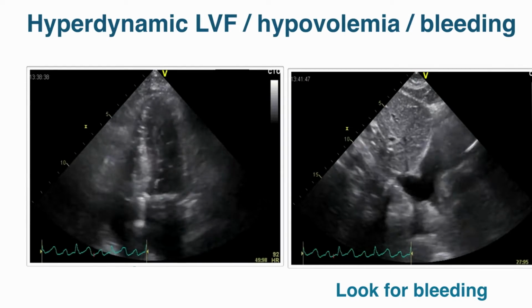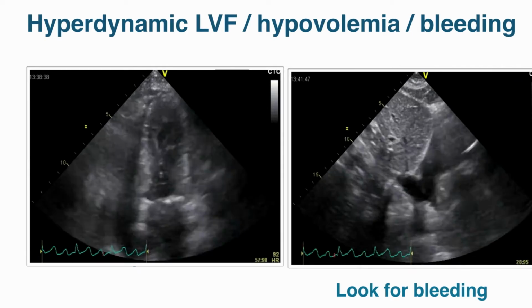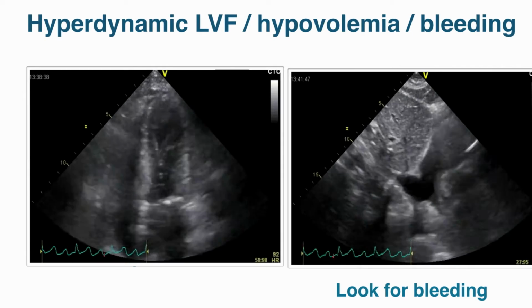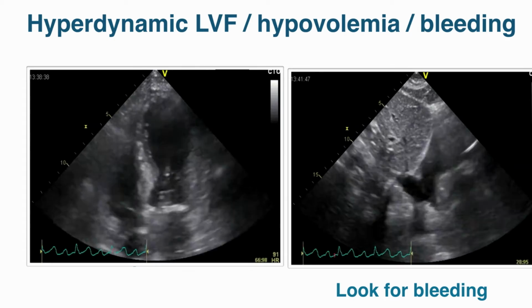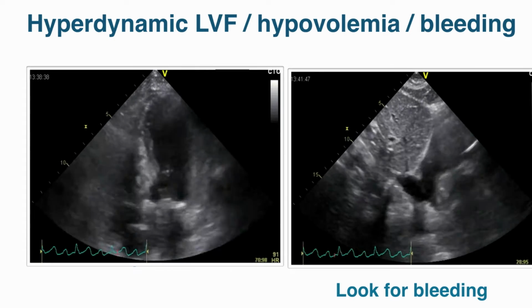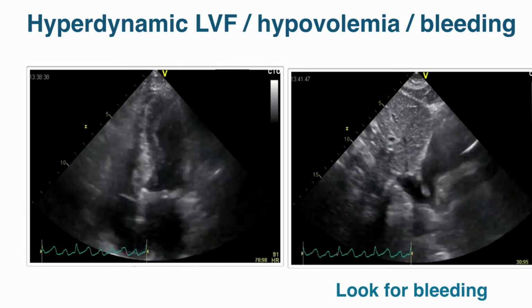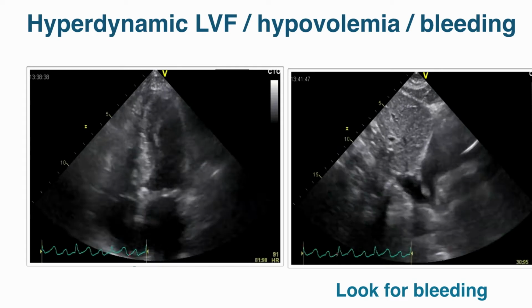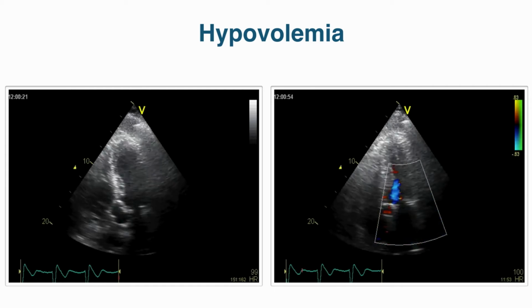during sepsis. On the right side, we can see the collapse of the inferior vena cava, that is a typical sign of hypovolemia. Easy to separate the two, but we will hear more on this in the chapter on volume status. Yes, and if we look at this example here, here are some additional findings that you will find.